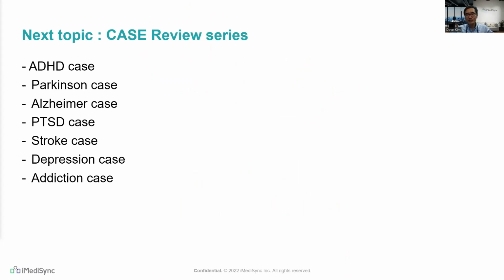I'd like to finish the presentation. This is the demo, which included iSync wave recording to iSyncBrain and iSyncHeart quick report, and review full report on the web portal, and introduced the manual denoising process and strong group statistics function, including normative library. From the next meeting, I'd like to start reviewing real disease cases, my cases and user cases together on the iSync QEEG precision mental health platform for the future telemental care.